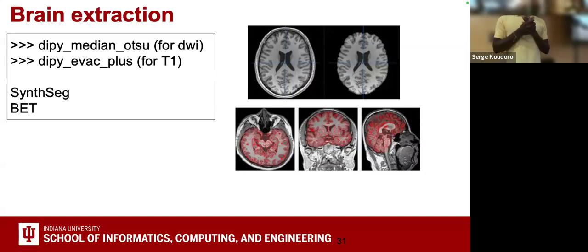The Otsu method, what it is, is just, you have your picture, you take a histogram of your picture, so you have all the different intensities, okay? And then you try to maximize the variance between classes. So you try to find the best threshold in your histogram to split your data. So if you have a histogram doing like this, super high here and super low here, it will split here and say, okay, this is a skull and this is your data. It works very well for DWI. It doesn't work at all for T1 images. I suppose in the fMRI, it doesn't work at all.